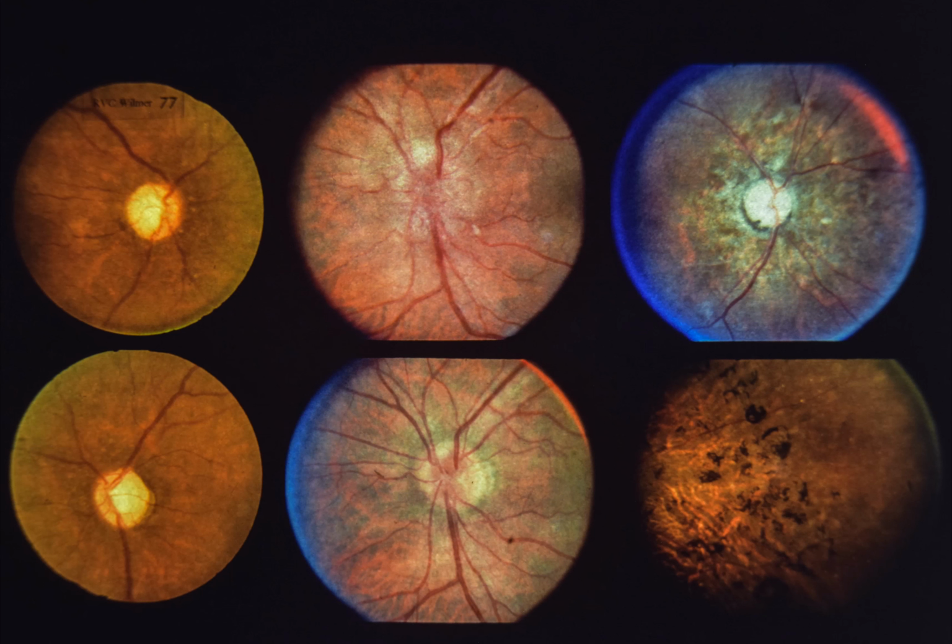This 35-year-old male with a positive serum and spinal fluid STS had normal visual acuity, unilateral optic disc edema, and CSF pleocytosis. The patient's optic disc edema resolved completely with appropriate antibiotic therapy. In some patients with neurosyphilis, an optic perineuritis involving the meningeal sheaths results in optic disc edema with normal visual acuity. Such cases are usually bilateral, but may be unilateral as in this patient.